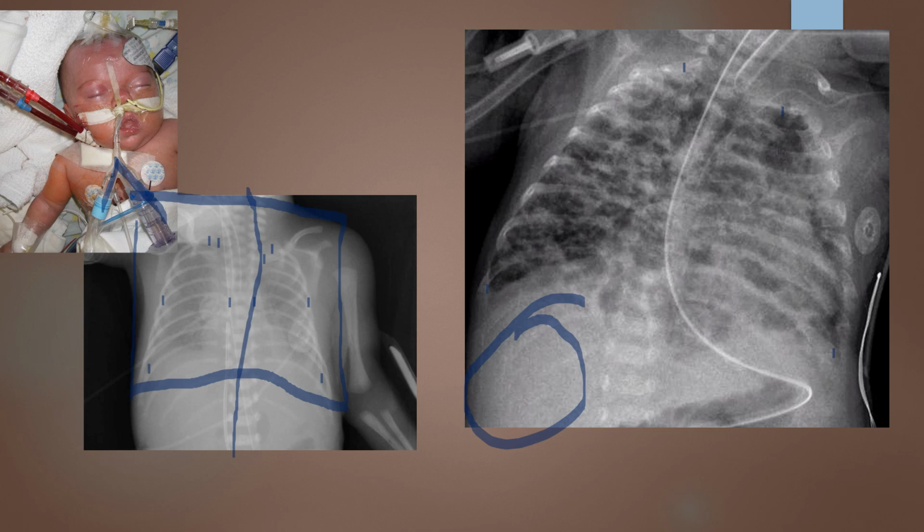So I'm going to look at the mid-coronal plane. I can see this is the left lung. Here is the right lung. I almost have twice as much on the left as the right. That would indicate that my patient's vertebra has been moved toward the right, which would indicate, if this was AP, that my patient was in an RPO position. Excuse me, I said that incorrectly. If the spine was moved towards the right, my patient would be in an LPO projection.